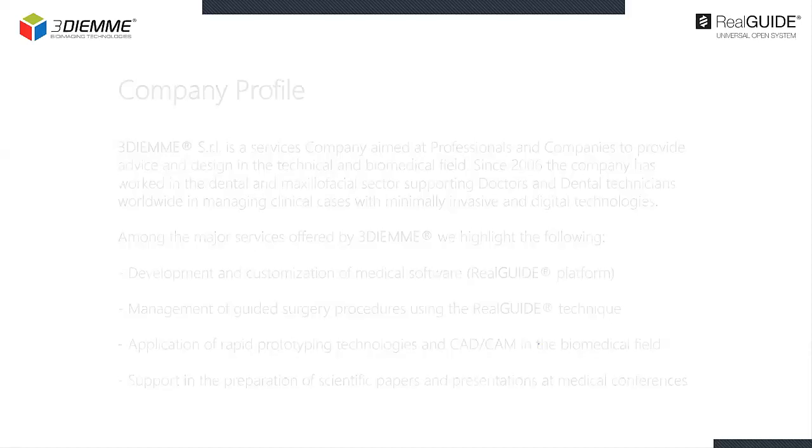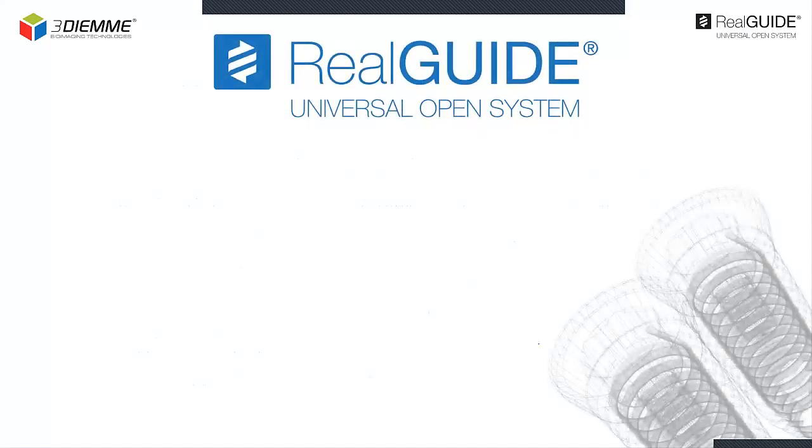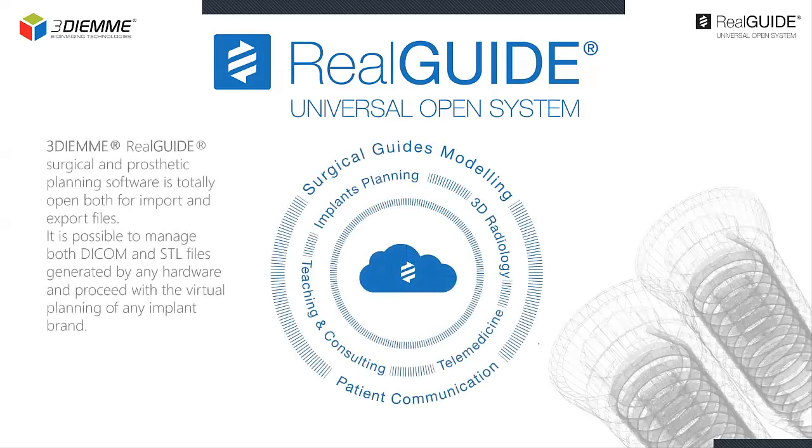But what is Real Guide? Real Guide is a totally open guided surgery and prosthetic planning software, which means that it's possible to import both DICOM files for hard tissue information, bone and teeth, and STL files for soft tissue information from any equipment: CBCT, desktop scanner, intraoral scanner, it doesn't matter what brand is used for the data acquisition.